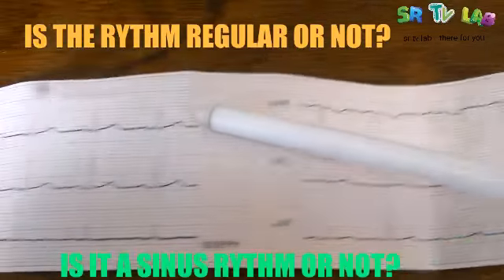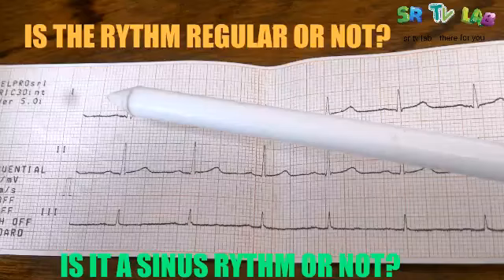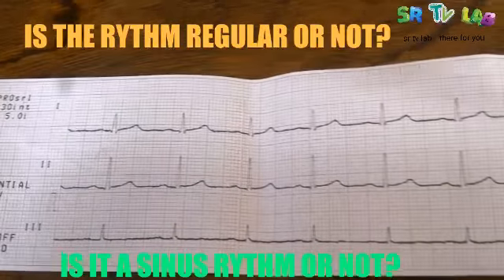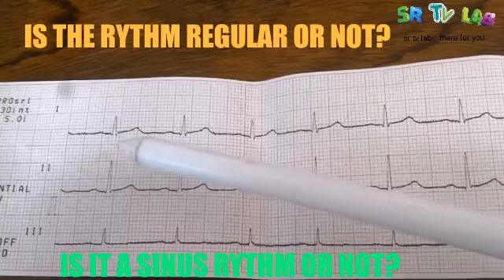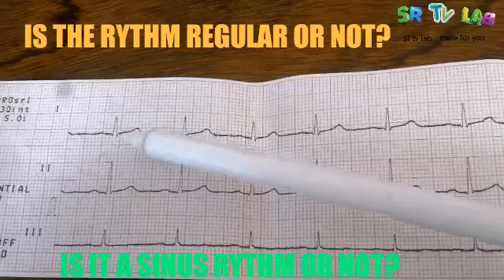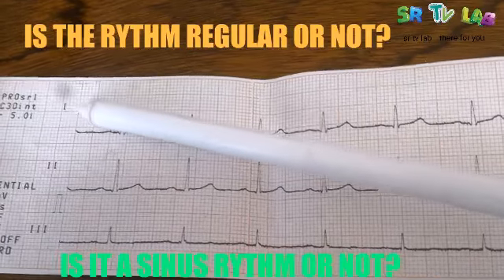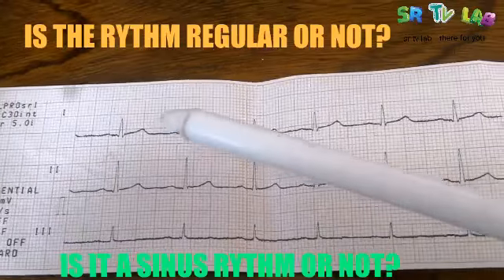Good. Now, the first interpretation on this electrocardiogram is this. You have to see, is the rhythm of the heart regular or irregular? How do you find out? Let's start from the limb leads. Bipolar limb leads. Lead 1, lead 2, and lead 3. Good, let's see.